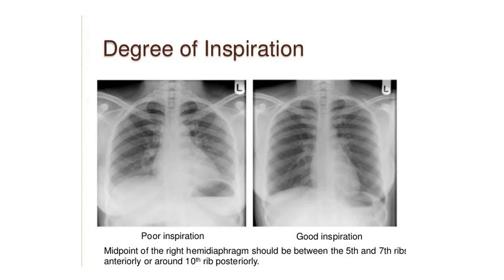inspiratory film or adequate inspiratory film, whereas if it is less than that, then it is called poor inspiratory film, and if more than that, then it's called hyperinflated lungs. So hyperinflated lungs seen in the obstructive lung pathology, whereas the poor inspiration can lead to the obscuration of pathology, magnification of heart.